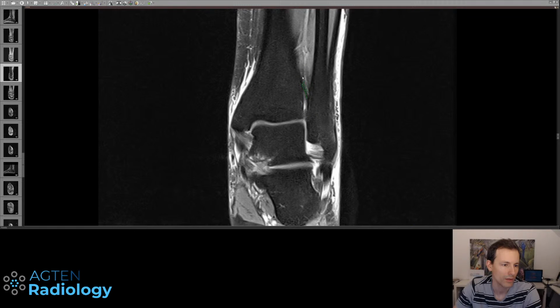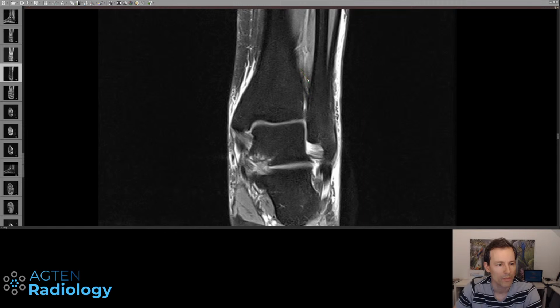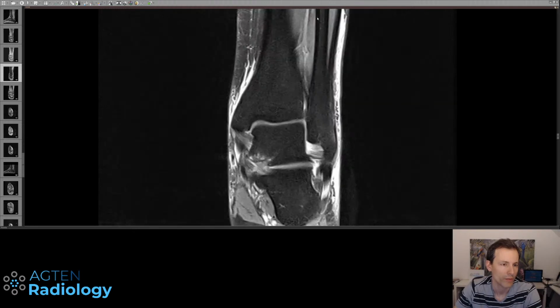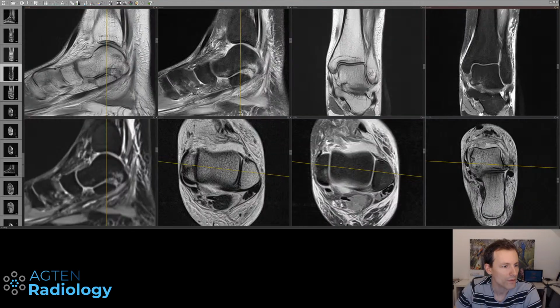You can see it here, here. So if you have a lot of edema in this region, you should be a little bit more suspicious of any kind of injury to the syndesmosis itself, but it's actually pretty normal here, so no injury. And if you see something like this and the fibula is okay, make sure you don't miss any kind of Maisonneuve fracture. So syndesmosis is fine.